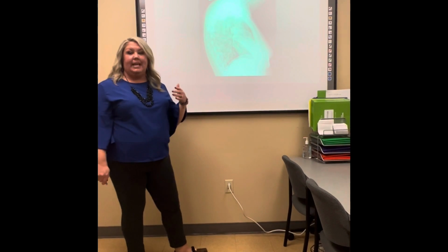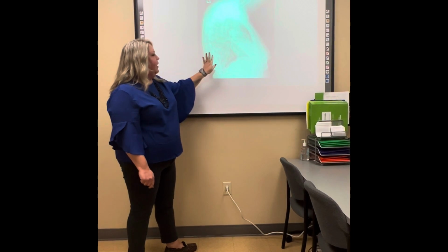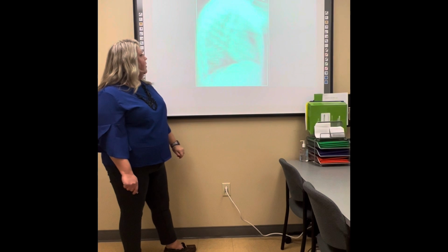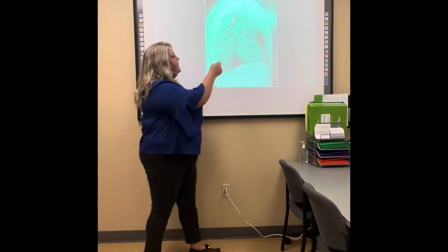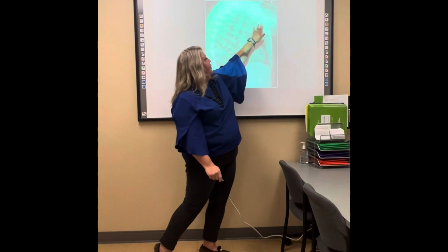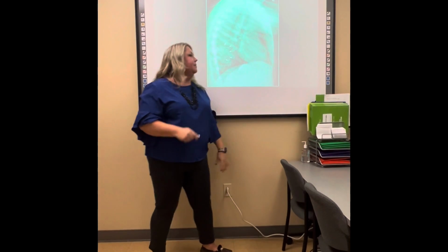Okay, here's an example of some rotation. You can see how the ribs are not superimposed on one another, and you can tell that that patient's rotated one way. And even though the arrows are pointing to the vertebrae in this picture, I like the picture to use as an example of this is soft tissue overlying the lungs, all through here. This is because we didn't get the patient's arms up, and that soft tissue is overlying the lung field.